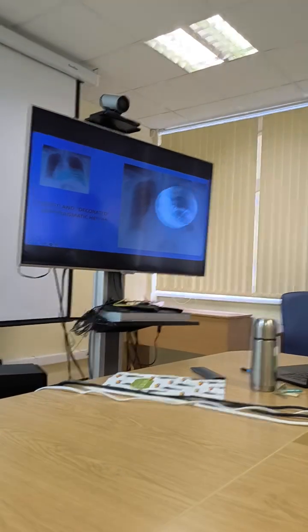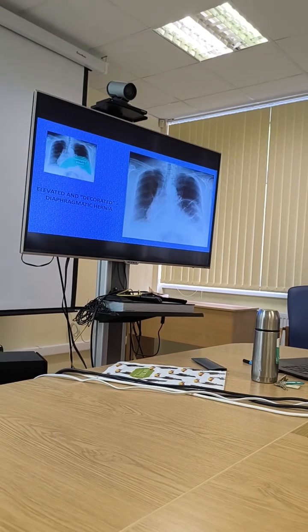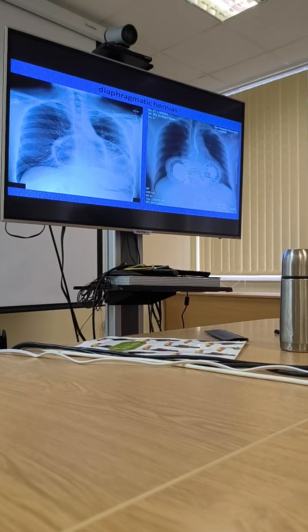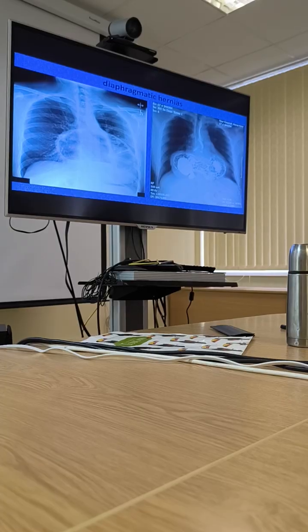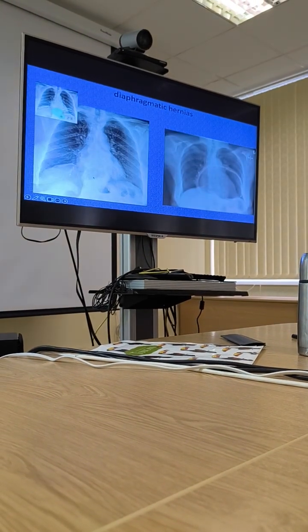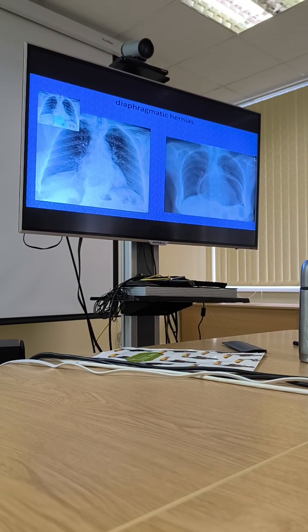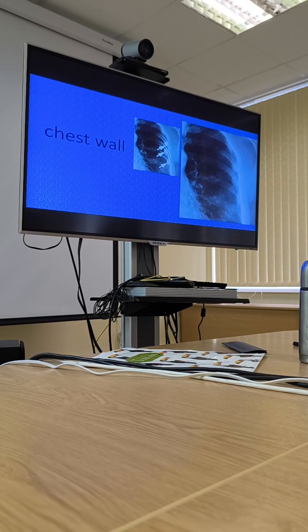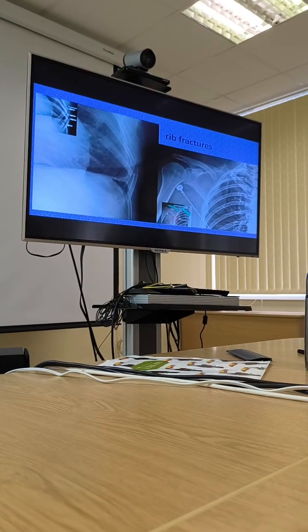And this unusual shape, this decoration, is due to the presence of abdominal organs such as the stomach and intestinal tract, and we can recognize where it is situated. So pay attention to this, and these can be very special pictures. Diaphragmatic hernias are very special, pay attention to them. And some words about the chest wall, because we can assess it, and we should pay attention to this too.